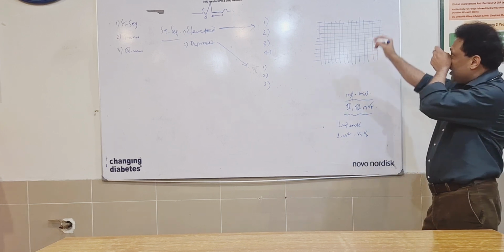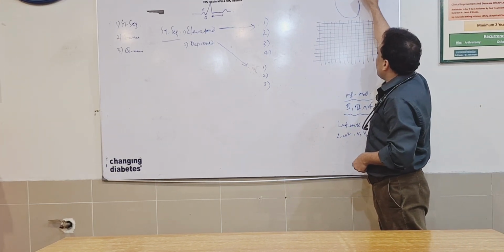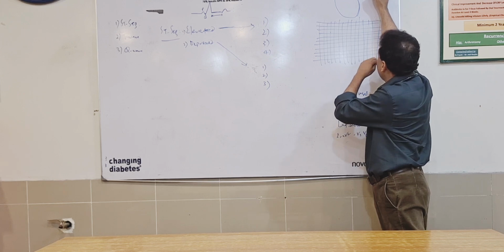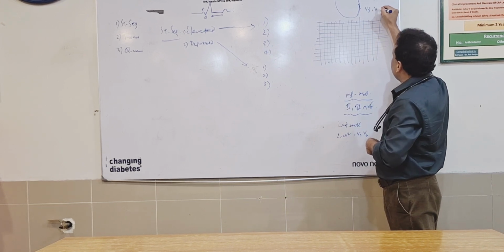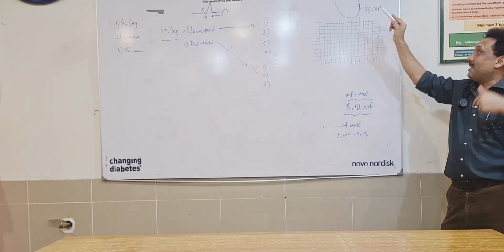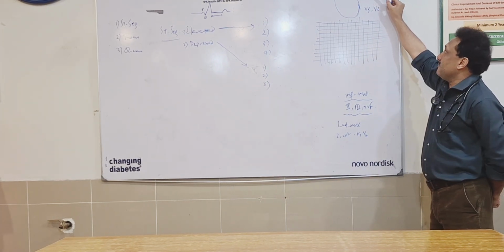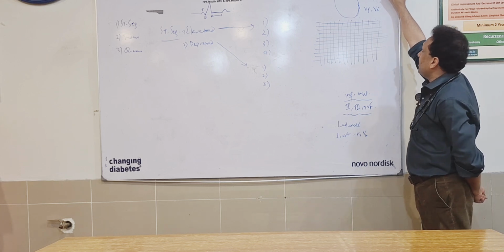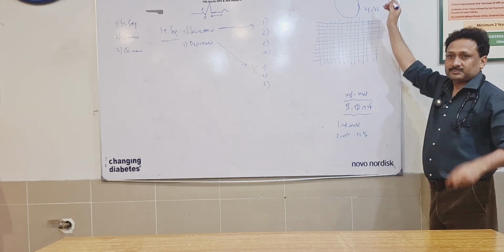As I told you about the heart, this is the lateral wall. The high lateral portion is represented by 1 and AVL, and the low lateral by V5, V6. So 1 is adjacent to AVL, and there would be ST elevation in 1 and AVL like that.